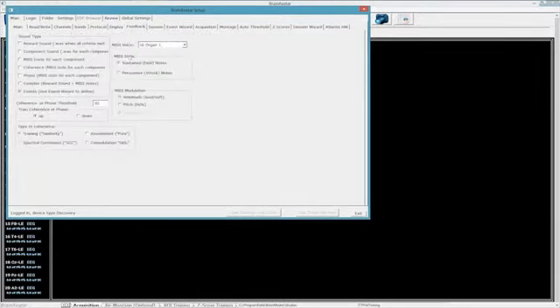Then you go to your feedback page and you say, well, what kind of rewards do I want? And of course you can do your reward sound, which means when all your criteria is met on that page, you get a bing. You can do components, which means each of them are individual. You can do a MIDI, which means there's a different note for each of the components. That was the original software. That's how it worked. That's all there was to it.